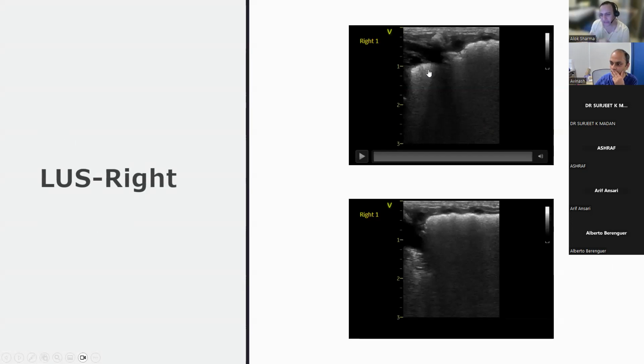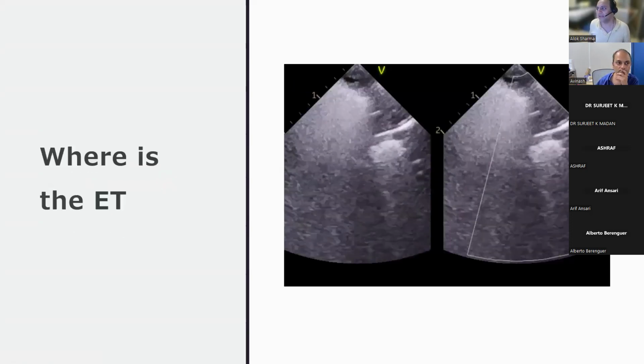If I think mentally that this might be a pleural effusion, it would be highly unusual in a baby that's supine to find such a focal pocket of effusion, while the rest of the lung, especially the lung bases, where you expect fluid to accumulate, doesn't have anything. So again, it is all about clinical correlation in situations like this.